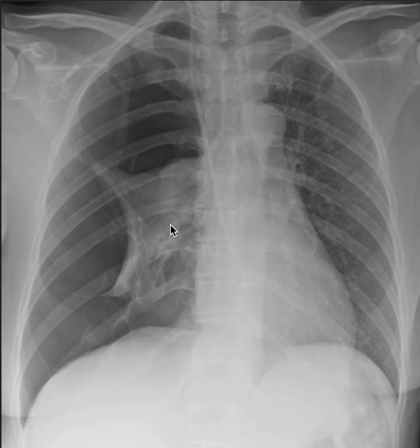The lung here is completely deflated and atelectatic. And very interestingly, you see a portion here that is tethered to the pleura. This is a pleural adhesion. Notice how the diaphragm here is flatter, and there's a deep sulcus sign as well.